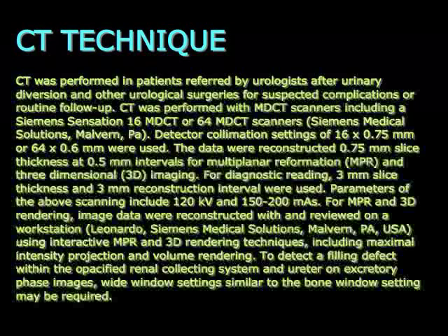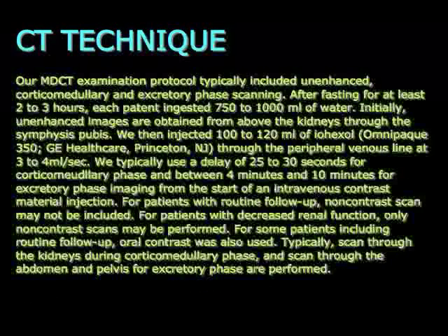So our typical examination requires non-contrast, cortical-medullary and excretory phase imaging. A key thing, of course, is to wait long enough. There are some decision processes that go on about how long you should wait. For the orthotopic, we'll typically wait up to about 10 minutes. Again, waiting a bit longer is better than waiting too little. Too early, you're not going to get good opacification.